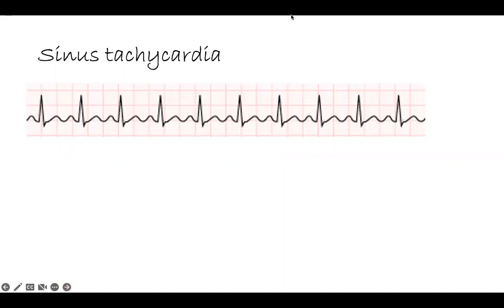So we're going to take that and take each of the rhythms and ask, does it match what we say? Okay, so this is a rhythm they've given us. First, we want to check if the rhythm is regular or irregular. That's my pathway right there. Is this an irregular rhythm or a regular rhythm? So I count between my R's. Here I have 1, 2, 3. I have 1, 2, 3, 1, 2, 3.